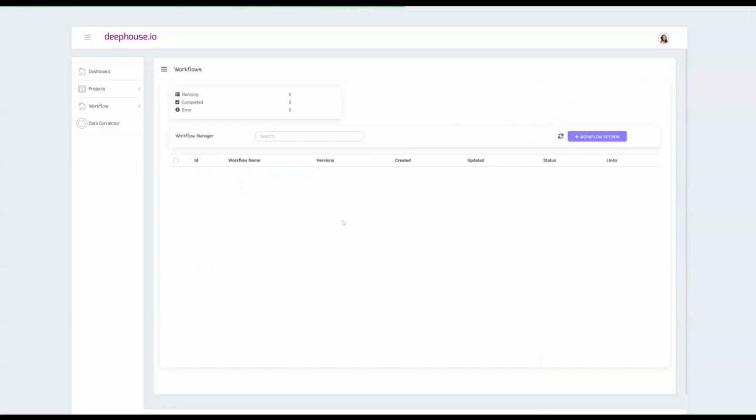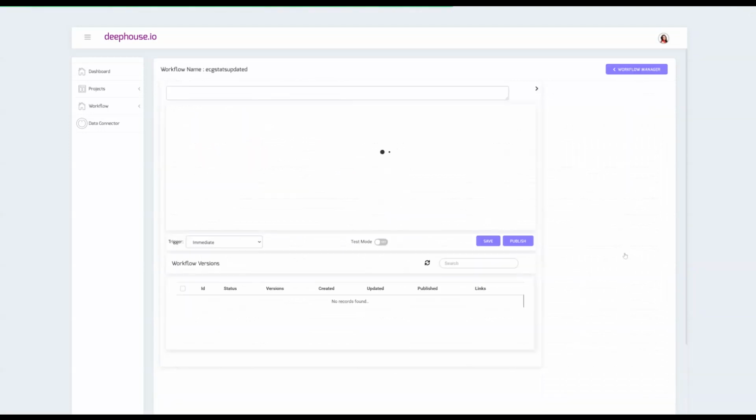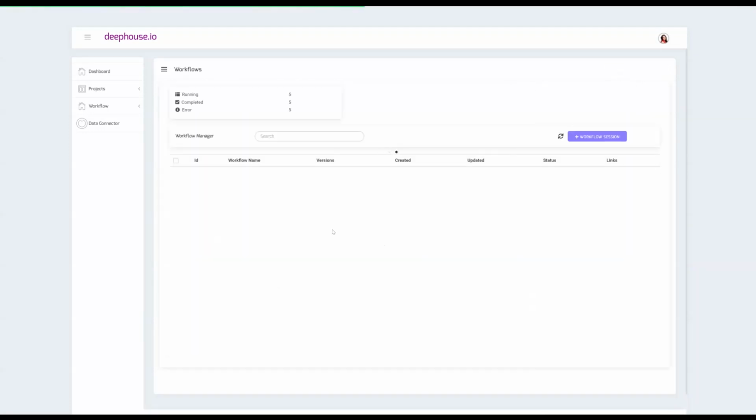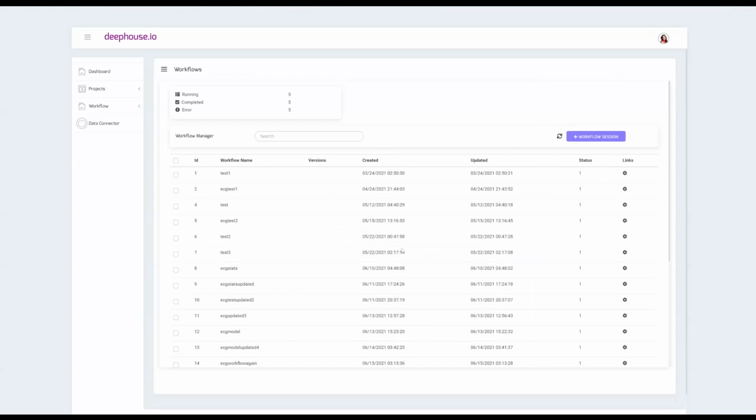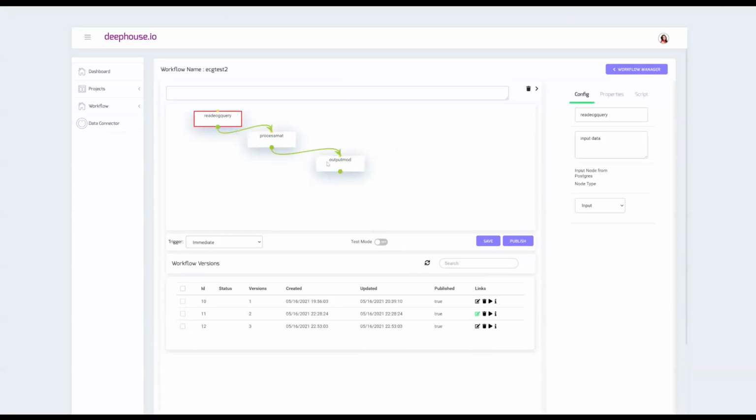So how do we generate that model? The model can be generated through the modeling phase, which I'll bring up here. Right. This is a workflow to show that.